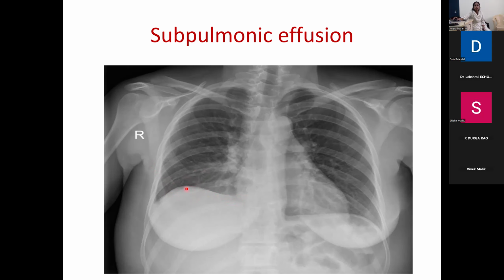So it will be mostly a subpulmonic effusion. You can take a lateral decubitus view to confirm it, and if ultrasound or CT is available, then you can go ahead with it. So always try not to miss the subpulmonic effusions.